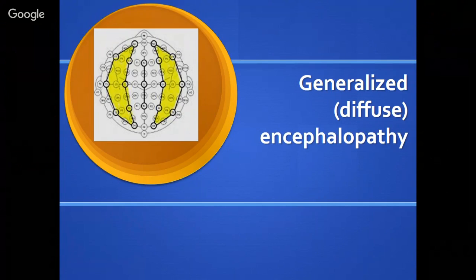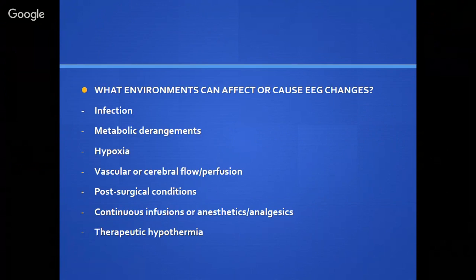And the famous or infamous bipolar montage, with way more than 20 electrodes there. So this is possibly maybe like a 48 electrode bipolar montage. We also call it the double banana because as you can see, there's two bananas drawn there, so it's called double banana. All right. If you have more electrodes, the chances are to try to capture more epileptic abnormality, possibly in a pre-surgical patient.